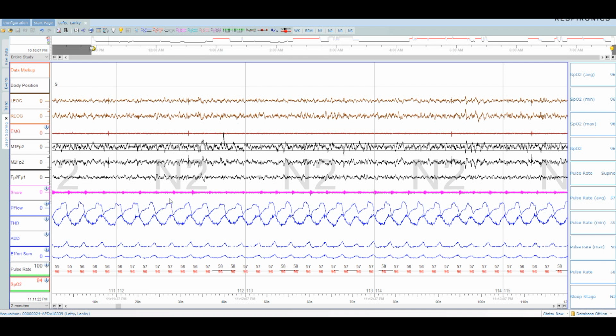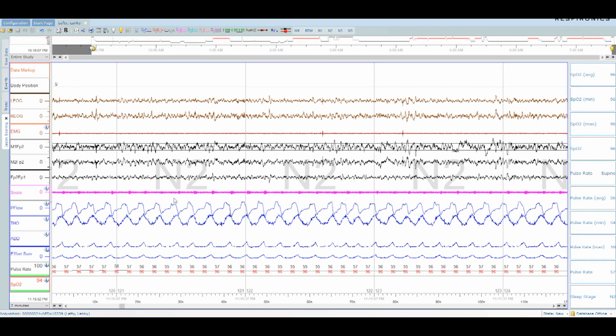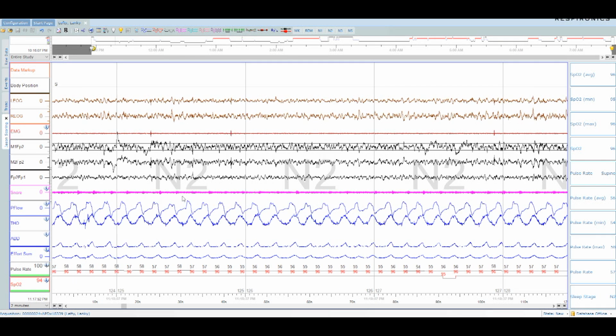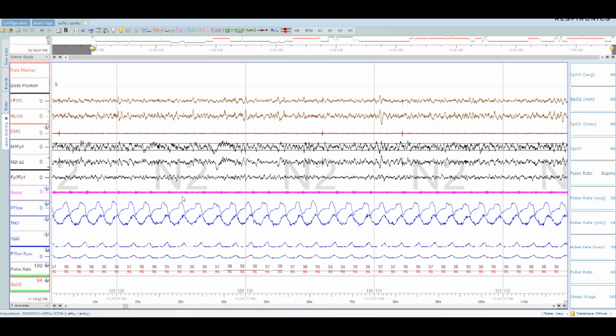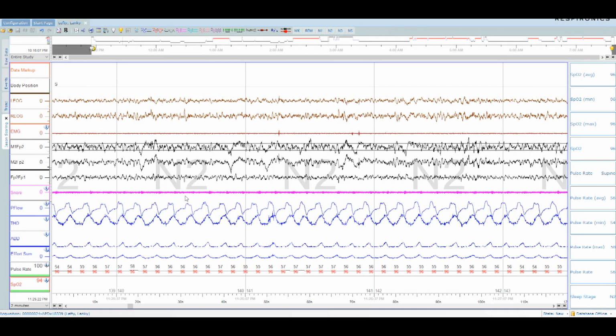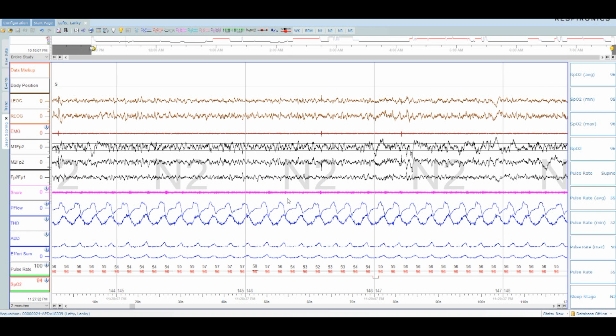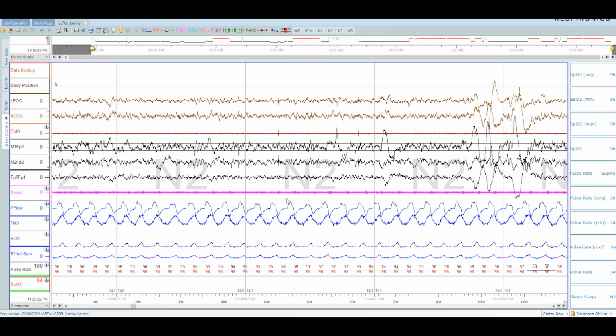Very interesting. Very snory. And my wife told me I didn't snore on either night, which was a little disconcerting because I typically snore if I don't use any therapy. So I'm kind of wondering what this is all about. It looks like it's at the exhale of the breath, so could be one of those little things.